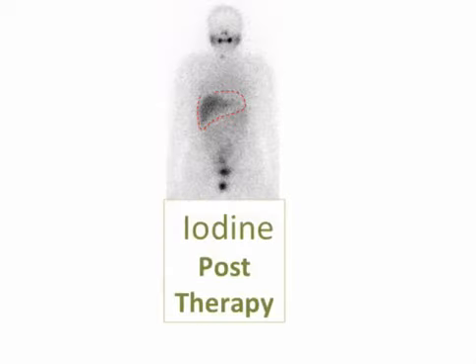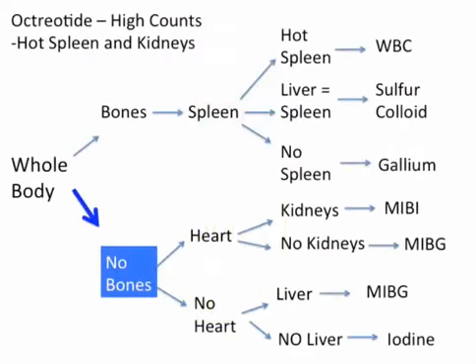So here's an iodine study, and you can see some faint bowel uptake. A little bit right here too. A little bit of residual thyroid. So this is an iodine post-thyroid therapy. All right.